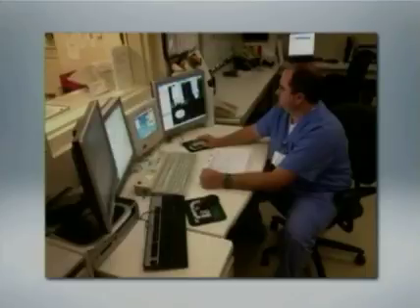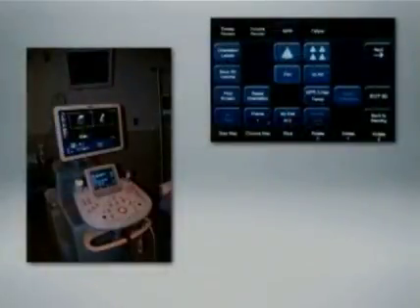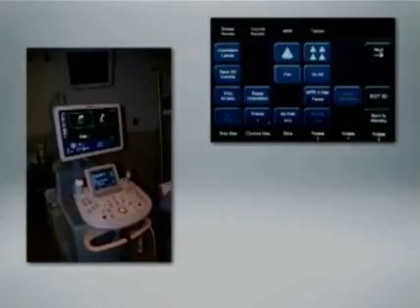However, if we want to do some non-standard reformats, we can call the CT technologist who sits at the workstation and produces multiplanar reformats or volumetric images as needed. The corollary of that in ultrasound is shown here. That's the ultrasound machine on the left, and at the top you see a shot of the work page, and you'll notice in the middle there's a button called QLab. QLab is Philips software for doing analysis, including slicing and dicing volume data sets and producing shaded surface displays.